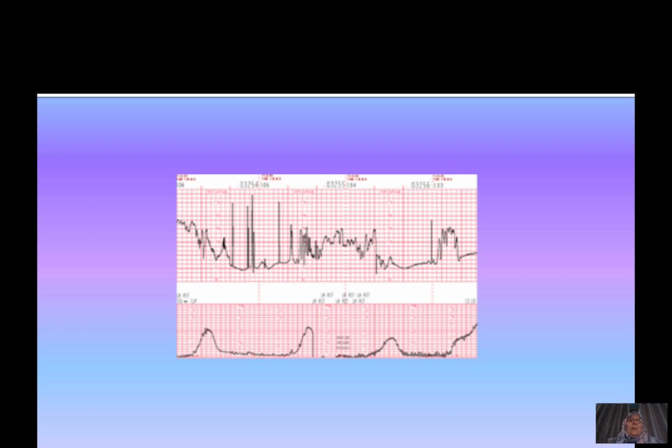So now we are coming to the part where we are going to look at some CTGs, and you will get the opportunity to take a few seconds and look at the CTG yourself at first, and then we'll discuss it together. So we'll start with this CTG. Some of these CTGs are difficult actually and not that clear, but I want you to just try yourself. So take your pen and paper, write down the features of the CTG. Be systematic with it, and follow the Dr. C. Bravado abbreviation.